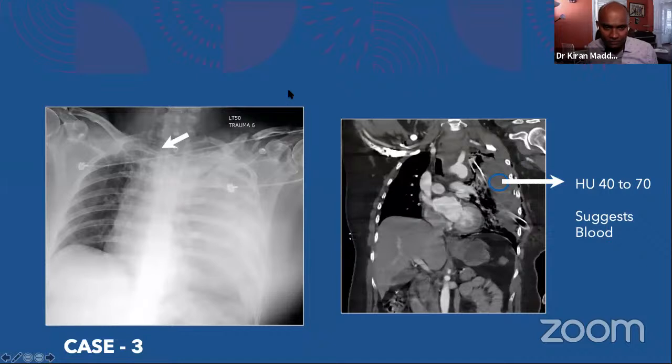Yeah, very good, very good. The left clavicle fracture is picked up by Abdul Latif. I appreciate it. So I'll come to that. Left clavicle and upper rib fractures are in the musculoskeletal section, but I should give credit to you. And then there is opacification of the left hemithorax.